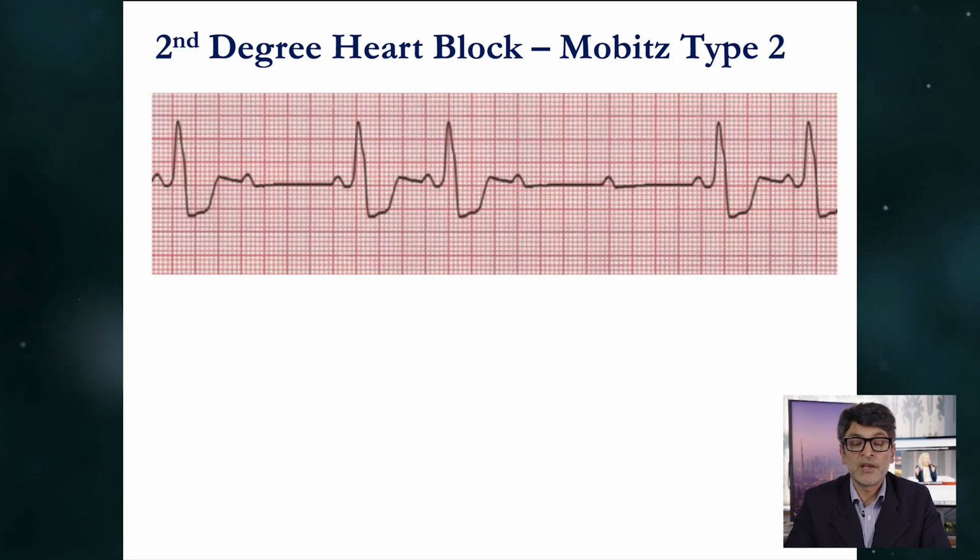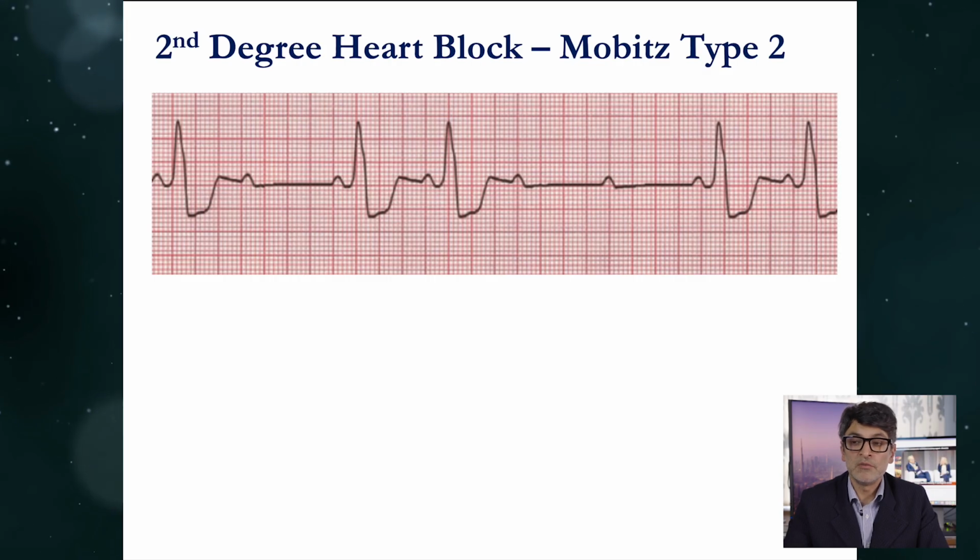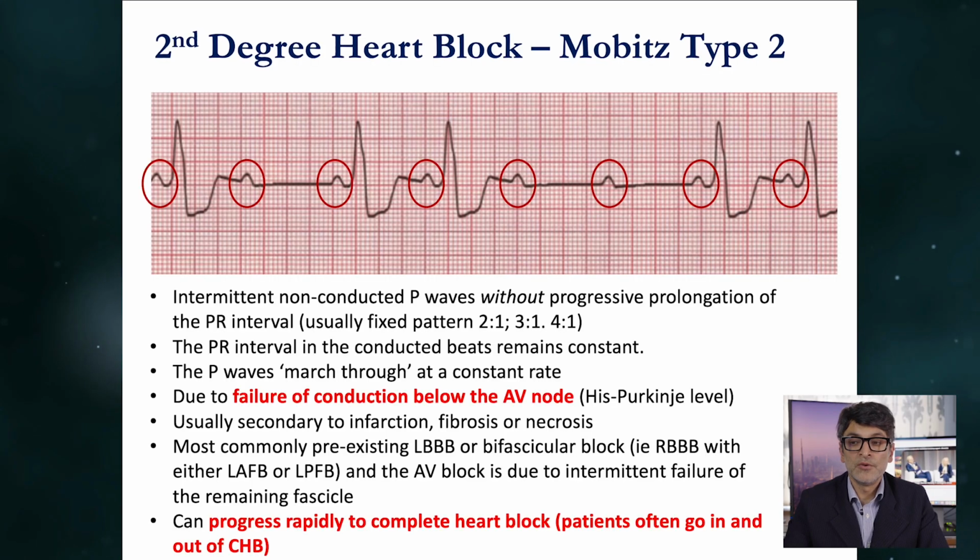And a lot of NHS trusts now have advice lines, which are typically email based, but you can actually speak to a cardiology registrar and come to an arrangement where you can email the ECG across. So the key thing is not to let the patient leave the consulting room until you have satisfied yourself that they are at no risk due to a red flag ECG showing high degree AV block.